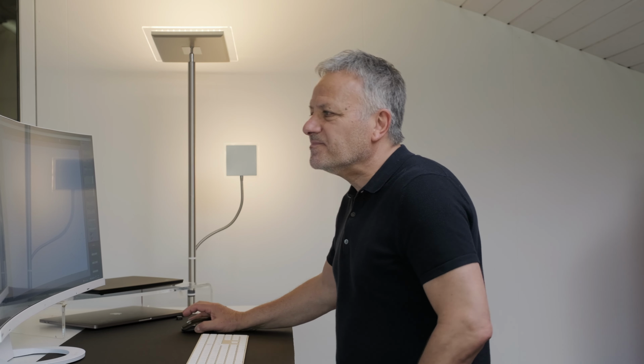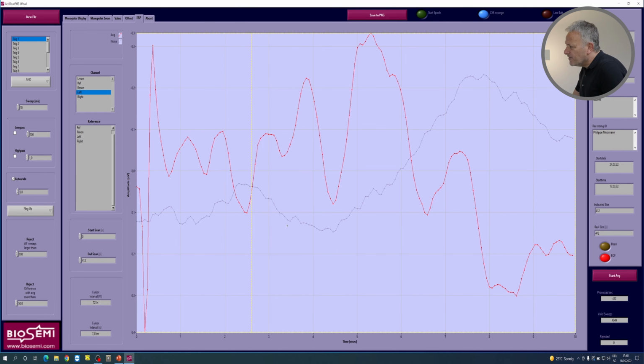Don't tell anyone. So what we have here is we end up with a waveform. We actually end up with 2 waveforms. One is gray and one is red. Now, red doesn't mean it's the right ear, it's just red because of the first trace. When we look at the actual responses on the screen, we see the gray. The gray is the noise.